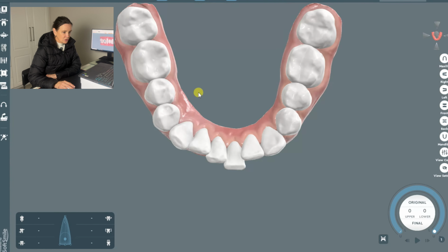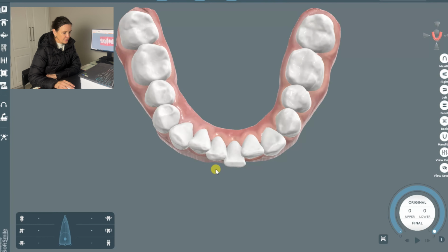One thing is to do interproximal stripping, looking at the premolars, never ever in the front. My rule of thumb is not to strip interproximally in the front, because when we need the space is now, and you cannot get an interproximal strip through there to reduce. You're going to do it at an angle, and that always shows afterwards. I've seen so many cases of patients who had interproximal stripping done, and it's uneven, it creates gaps at the top, or the angle is wrong, and it's visible afterwards. The patients are upset by that, and you can't close those gaps again.